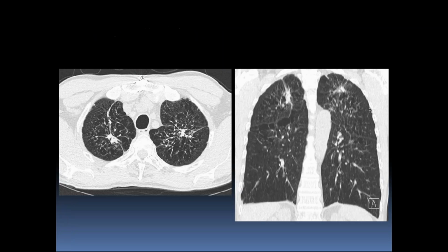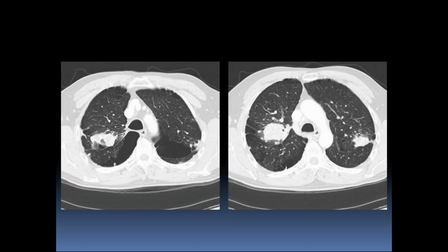And that's going to cause a greater risk of pneumothorax. So here, this is a gentleman from Kentucky. He had a long history of mining, and he came in for progressive cough and dyspnea, and you can see that there's an upper lobe distribution in the coronal reconstruction there, and you have the architectural distortion and the emphysema. You can see the bullous changes along the major fissure there on the right, and this is pretty typical appearance of uncomplicated pneumoconiosis or silicosis.